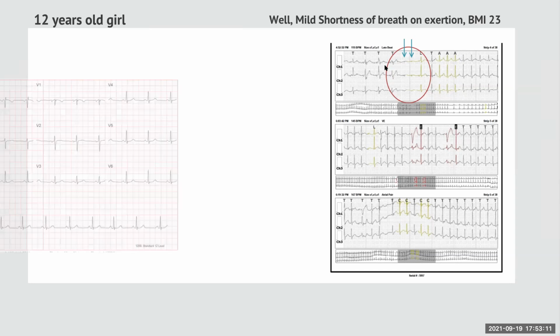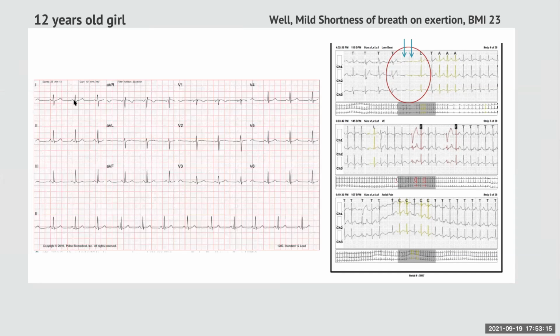Just look at the ECG in lead view, the P waves in lead 1 now on here. Okay, can you all appreciate it? Yes, they're positive. This is upright in inferior leads, and so this little girl actually had dilated cardiomyopathy because of atrial tachycardia, which was then ablated and resulted in complete resolution of symptoms. So this is wonderful. Now, this is something that again comes as a weird and wonderful thing.